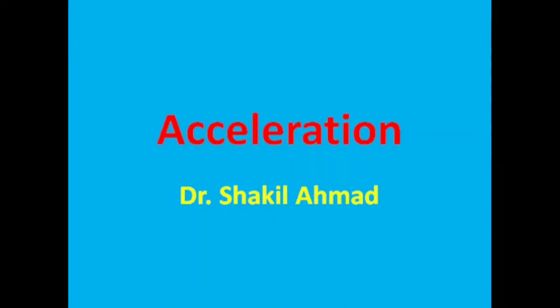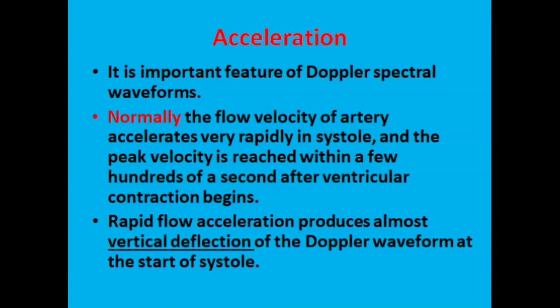Today I want to discuss the acceleration, an important feature of color Doppler sonography. It is an important feature of the Doppler spectral waveform.